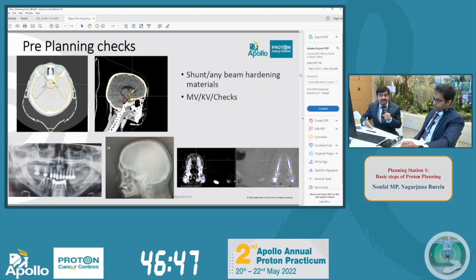So in our center, we adopted a new methodology. We have already explained it, but I'll tell you again, because it is very, very important. If you don't do this assignment, you are going to make your dose calculations completely inaccurate. So we take the MVCT scan, because you can always see there is an artifact behind in the scan.